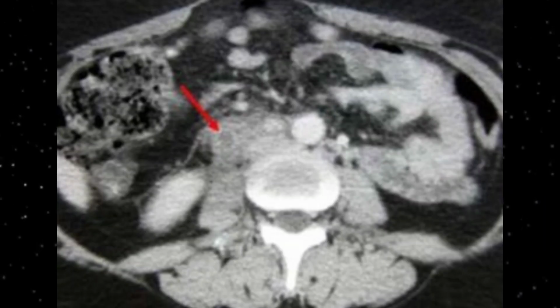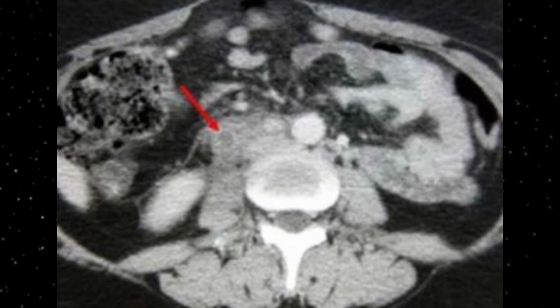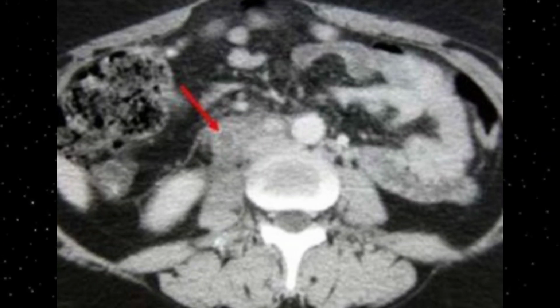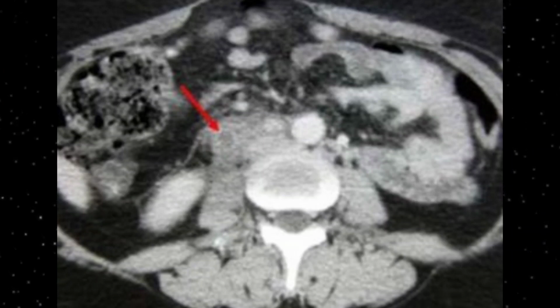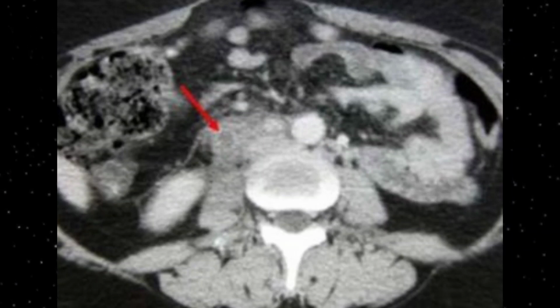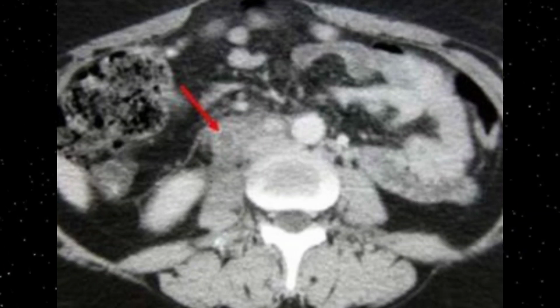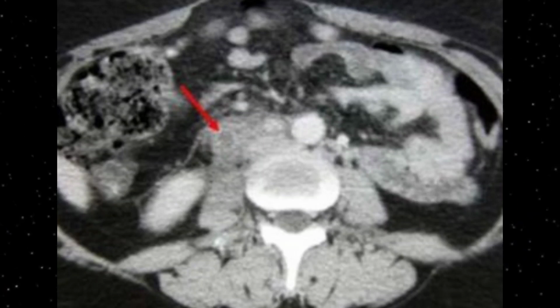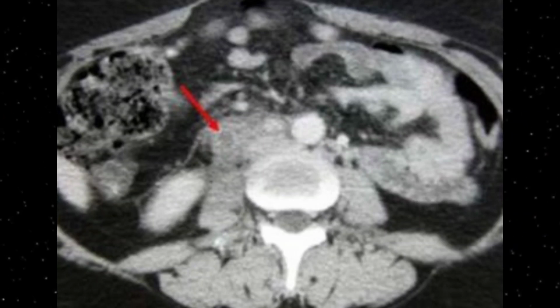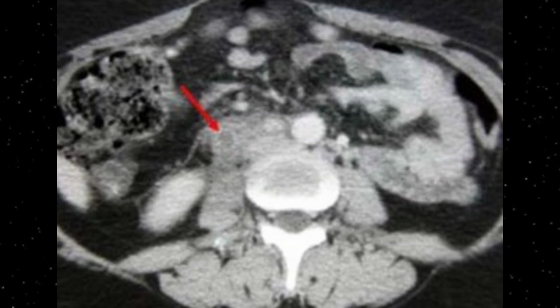Just to familiarize your eyes with the ovarian vein thrombosis on the CT scan axial images, here again is another example of the ovarian vein thrombosis, which is indicated by the red arrow. This red arrow is indicating thrombus within the ovarian vein. The ovarian vein peripheral wall is enhanced, however intraluminally you cannot see any contrast. So this is a filling defect. This filling defect can be seen on the CT axial image, and this is ovarian vein thrombosis.